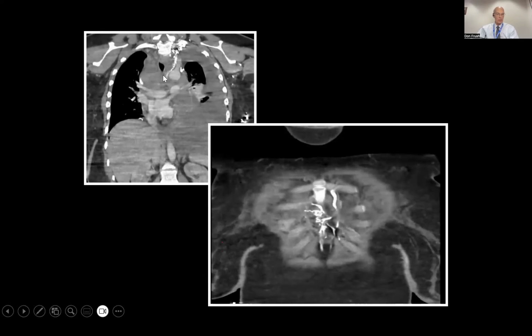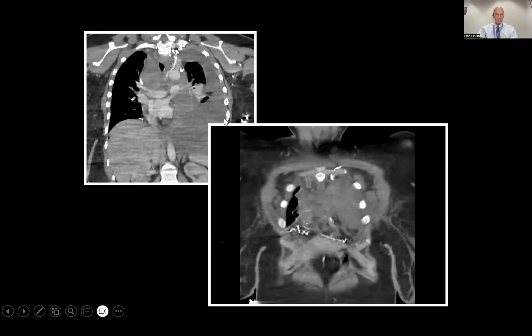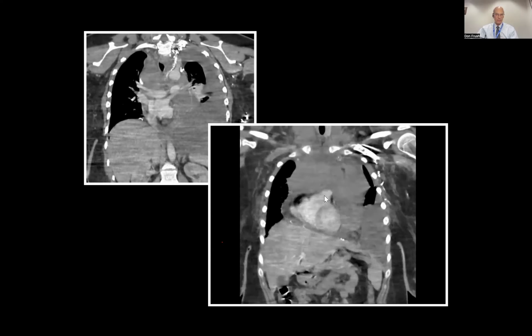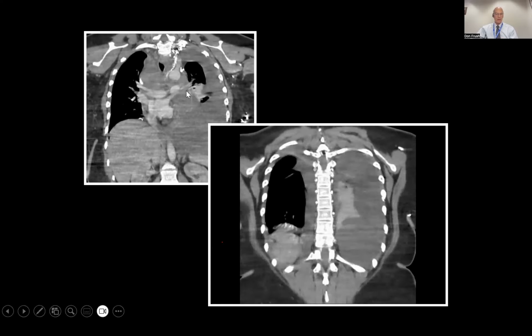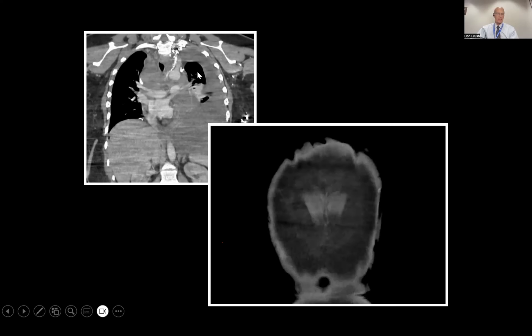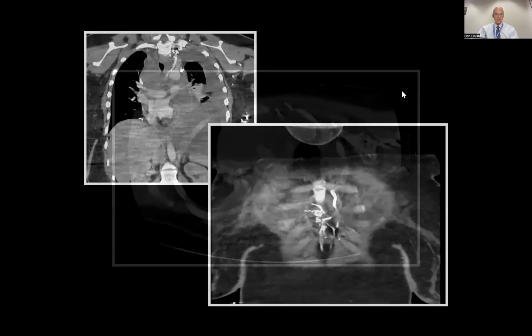That's a patient with lymphoma, and there's going to be lots of abnormalities here. There's a mediastinal mass, but there's a large left pleural fluid collection as we come through this coronal plane. This is all lymphoma here, pleural fluid collection shifting things over. So you don't want to intubate this patient and say we're going to re-expand that lung, because it's not collapsed from the standpoint of that causing the whiteness.